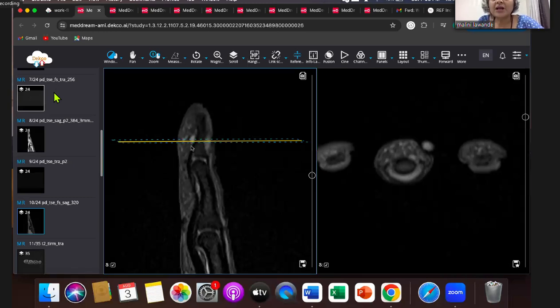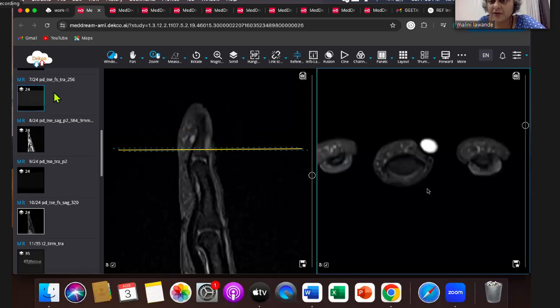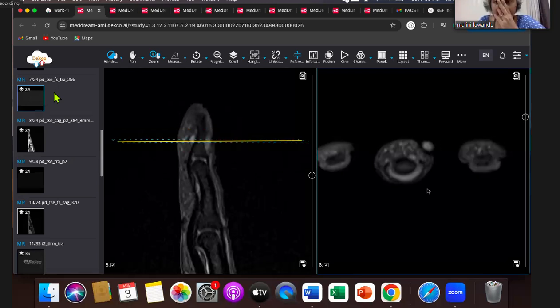In this location, the other common pathology could be an epidermal cyst or epidermoid cyst, because you may have had some prick, some foreign body, and then there could be an inclusion cyst. That will be more well-defined. That is usually larger. These are small. They can be large at times. You may have osseous involvement, but a very small lesion. So you have to be very, very careful. Look at the site of the pain very carefully. Dynamic contrast helps you a lot.